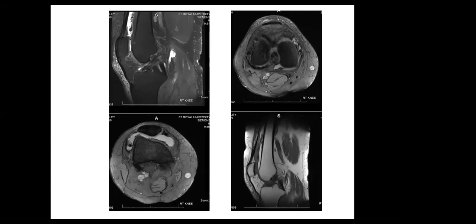There is abnormal signal intensity in the ACL ligament, and abnormal signal intensity at the Hoffa fat pad. Increased signal intensity.